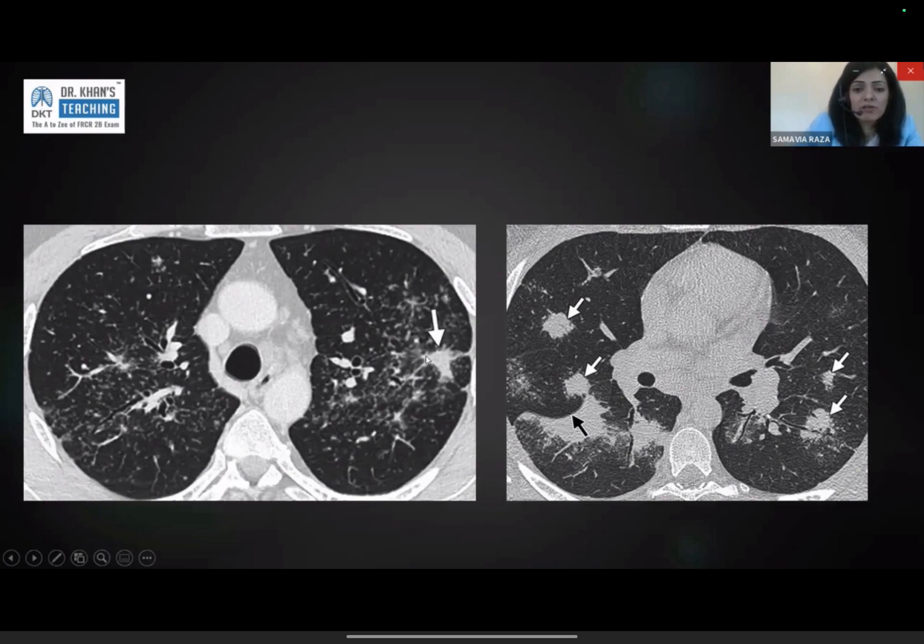If somebody asks you, are you absolutely sure this is not an incidental cancer in the middle of all that sarcoid change? The answer is no, there's no way of knowing. Are you going to biopsy that? No, you're not. You're just going to follow up the patient. These coalesced nodules can sometimes be very prominent. They can be bilateral and quite worrying looking, so the differential for bilateral metastatic disease comes into play. Sometimes, when you don't see the micronodularity around it and you see these bilateral, sizable nodules, it is worth getting a diagnosis just for reassurance purposes.